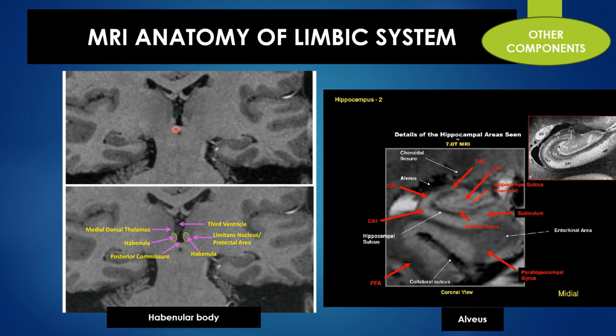which is just above the posterior commissure. The posterior commissure and the habenular commissure together constitute the germinating seed appearance of the mid-sagittal anatomy. In the mid-sagittal anatomy, we tried to identify two structures, namely the W structure anteriorly and the germinating structure posteriorly. The germinating structure superiorly is for the habenular commissure, which went and ended in the habenula, which is well seen in this coronal anatomy. That's slightly parasagittal. Okay, so it is in the coronal view that you'll be able to see the habenula. Habenular commissure is better seen in the sagittal anatomy. Okay, we'll move on to the next thing.